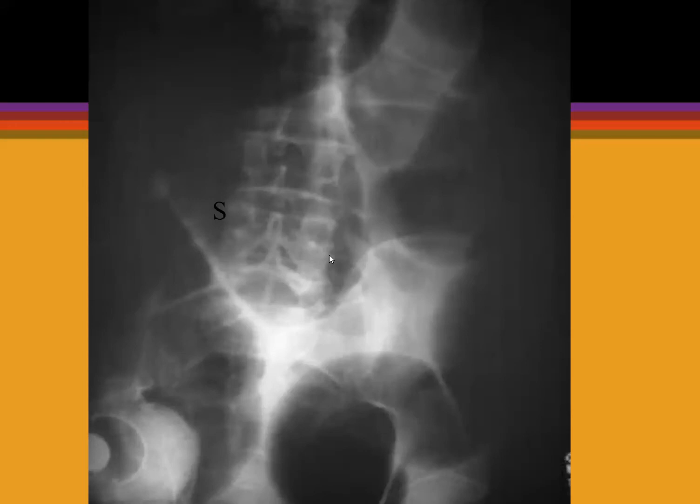It's such a large mesentery. It's twisted and flopped upwards, and that twist is causing large bowel obstruction. There's this cecum over here, which is really dilated because gas just isn't going through to the rectum.